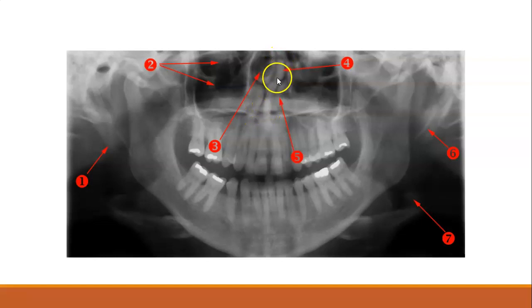What is this? That is a deviated septum. Isn't that interesting? And then this right here, it must be some kind of growth. They're calling it the concha bullosa. So I'm just wondering if it's either a benign tumor or something that has grown somehow where it shouldn't, and it's causing this deviated septum.